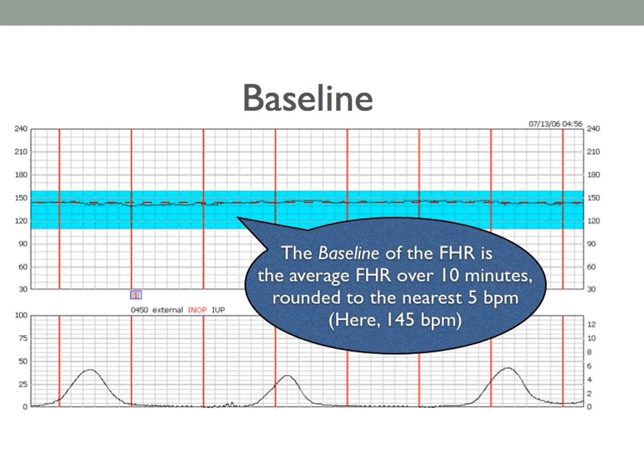In this case, if we look at it, I will tell you that this is minimal, almost absent variability. Okay, it's not absent because we see some deflections and accelerations or inflections on the picture here.